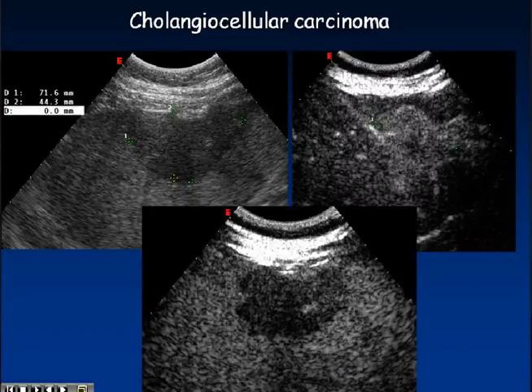So you have learned how metastasis in a healthy liver appears. If we go now to cholangiocellular carcinoma, there is no specific appearance. So it looks like a metastasis. It might enhance in the arterial phase, it often does, and it washes out in the late phase. There is no specific key feature at contrast ultrasound to make the diagnosis.